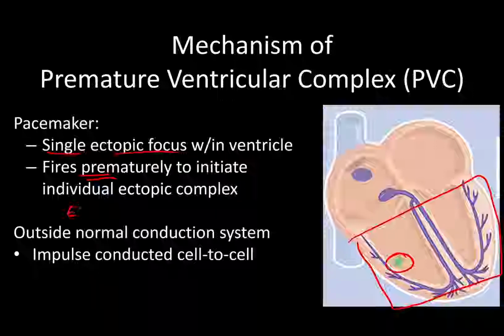It's, quite simply put, early, and more importantly, it is disorganized.